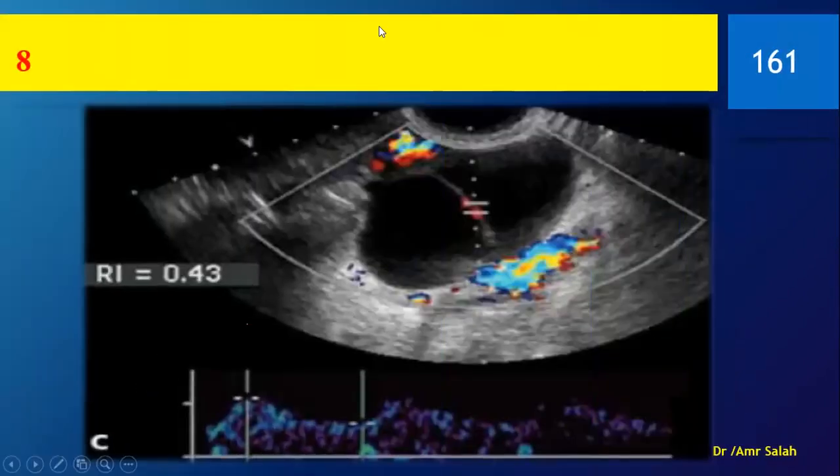I can see this lesion. It's ovarian, and it has septum inside, and there is vascular flow inside. Also note the wings. Tell me your full comment. Think about it for a second. Don't forget this. Okay, this is an ovarian lesion. This is an ovarian tumor, because it has vascular flow inside. And since it has this septum, I would rather say that this is multiloculated, the same as a mucinous cystadenoma or cystadenocarcinoma.